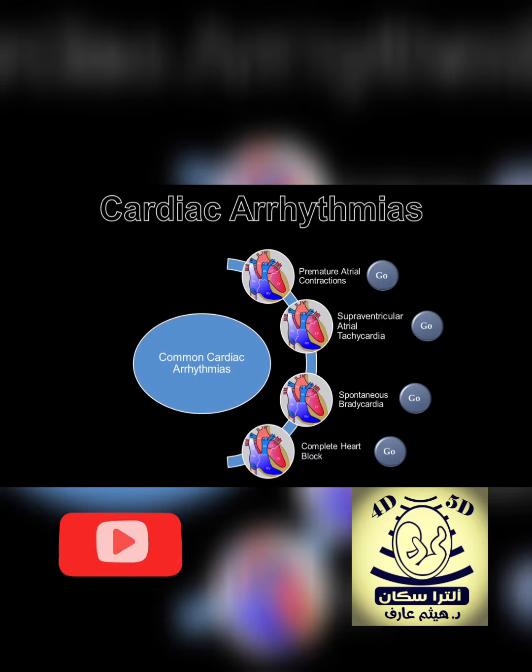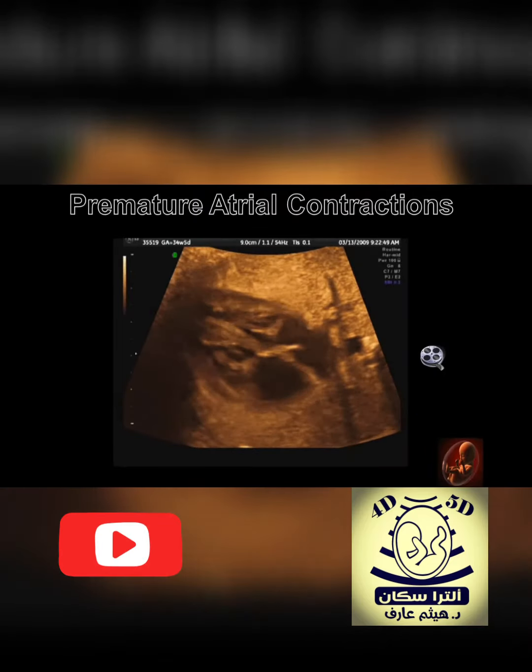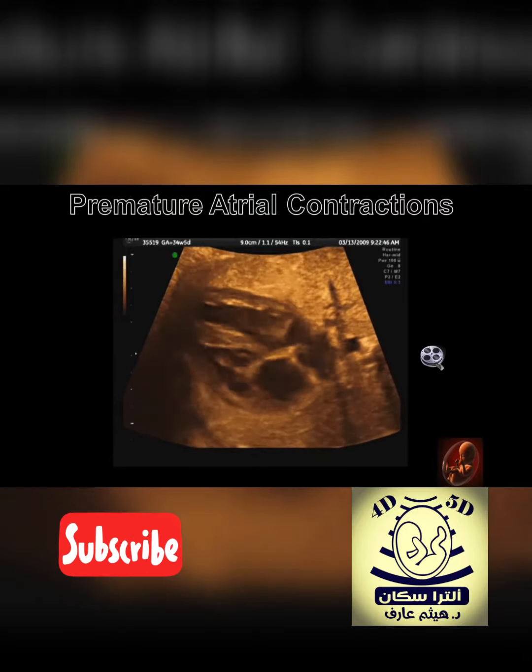In addition to structural abnormalities, fetal cardiac arrhythmias can be benign or life-threatening. This is a cine clip of a fetus with premature atrial contractions.